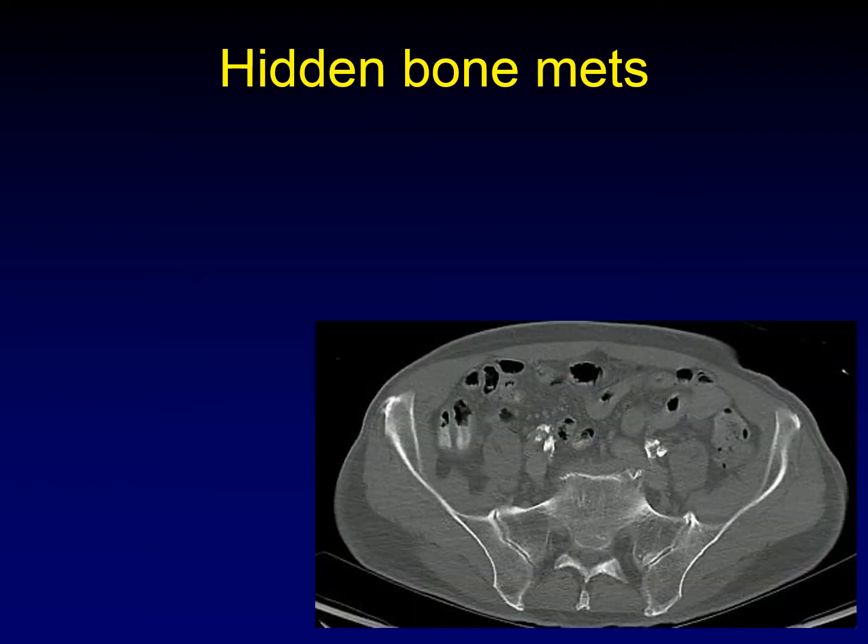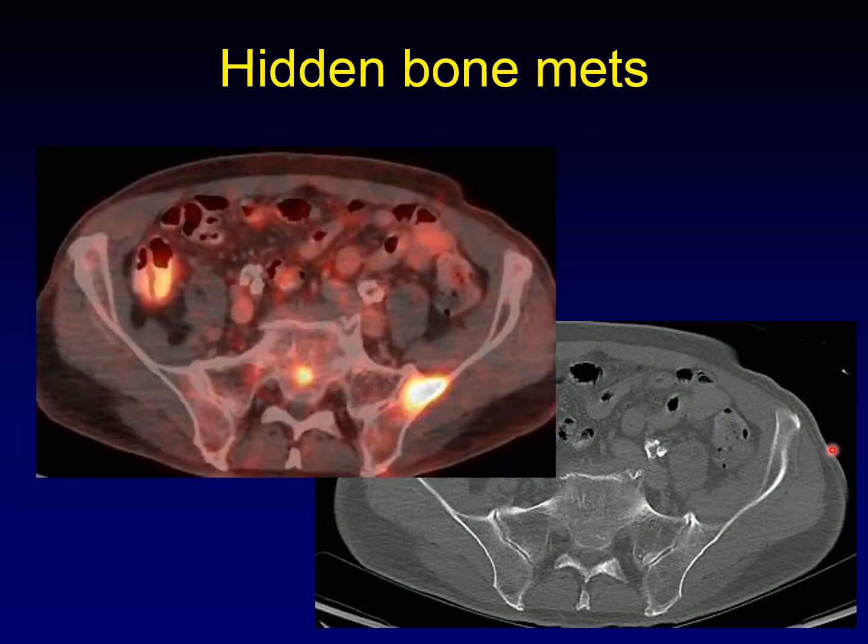Another example of hidden bone mets that there's no way I'm ever going to pick up on this CT. There they are, even in retrospect. I had no hope here. PET to the rescue for hidden bone mets.